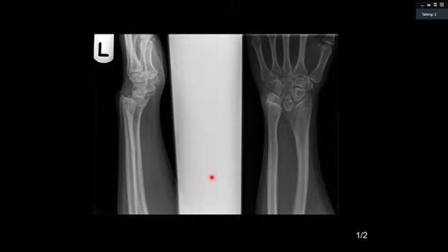I would have a look at the carpals, for any signs of shortened carpals to see if there are any signs of Turner syndrome. It doesn't look traumatic, which would be a less likely differential. So in summary, it looks like Madelung deformity of the wrist. Okay, well done.